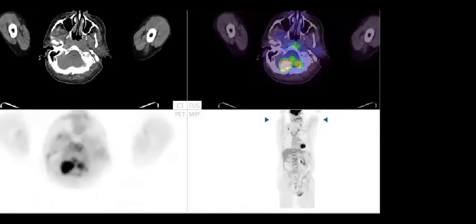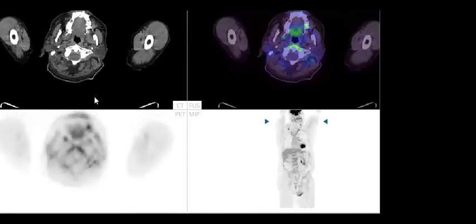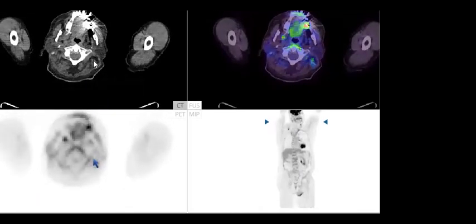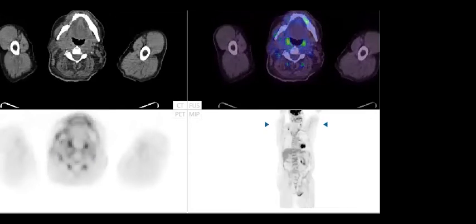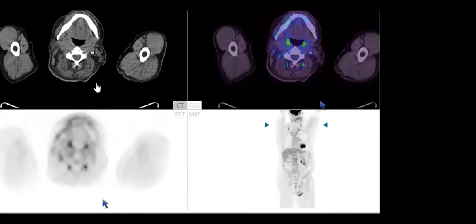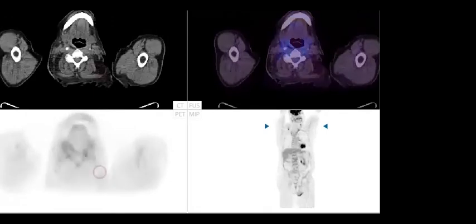Okay. Anyway, you are going to check the image, and the most important thing when you go to the neck is that you check for lymph node metastasis. Here it is very important that you go through the fat spaces in the neck and check carefully if there is any lymph node enlargement. One of the most important indications in PET-CT is to check for lymph node metastasis or lymph node infiltration. Lymph node infiltration like lymphoma and leukemia and so on. Lymph node metastasis from any tumor.